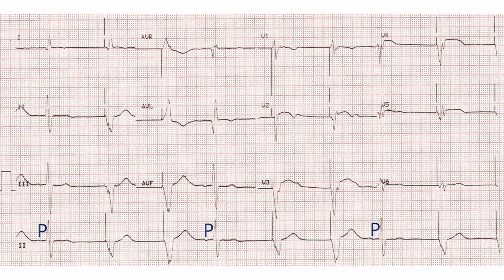Ventricular rate in this ECG is about 50 per minute, indicating a low programmed pacing rate. Every third complex starting from the first beat seen in the lead 2 rhythm strip is a spontaneous beat with a PR interval of 160 milliseconds.